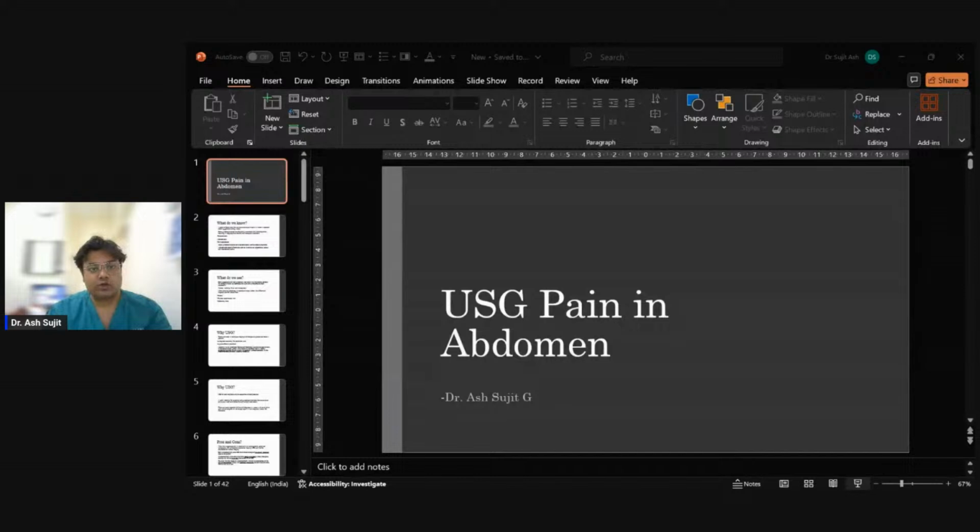There are two images of the ovary which you are seeing. In this, the right ovary shows a thick-walled structure with peripheral vascularity, which tells about a corpus luteum. Again, in the sonography there is a peripheral ring of vascularity consistent with a hemorrhagic corpus luteal cyst. While both of these can result in acute pelvic pain, depending upon the size and whether there is hemorrhage, acute intracystic hemorrhage or intraperitoneal leak are the most common causes of pain in the abdomen in these conditions.